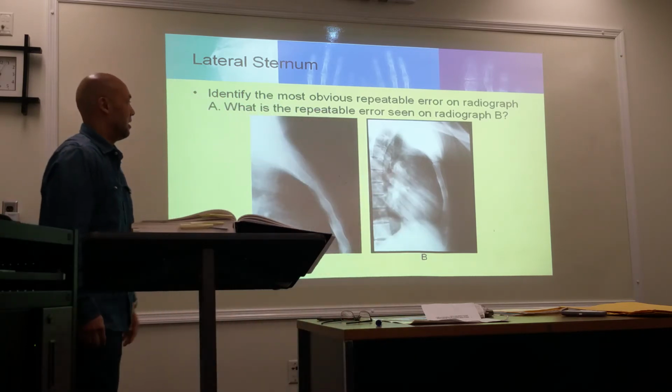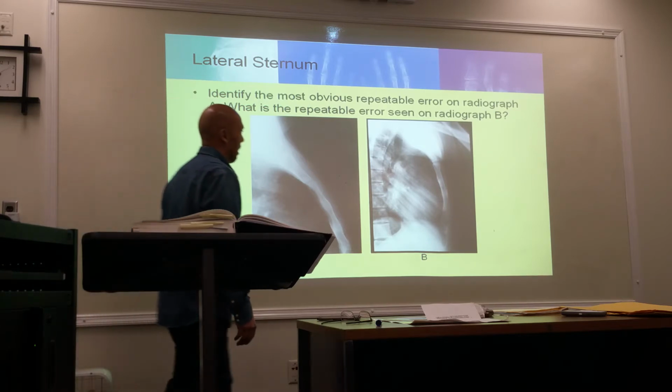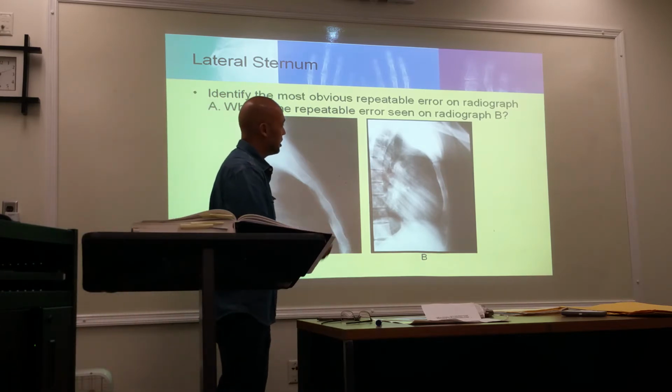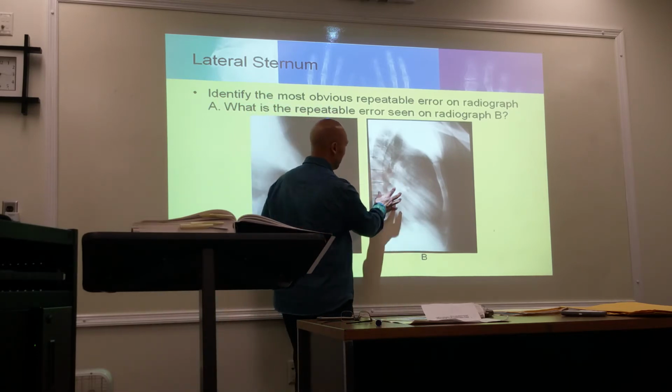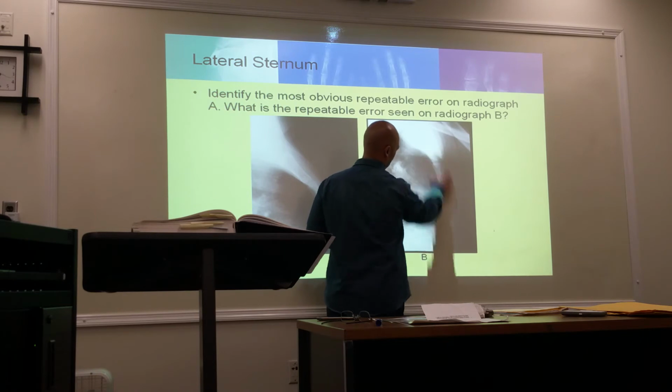Too much collimation? Okay, yeah, it's too wide open, right? It's too wide open. So there's a couple of things that are wrong with this one. First of all, it's too wide open. This shouldn't be a chest x-ray, it's a sternal x-ray.